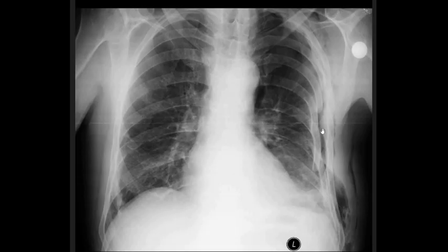And we can see that here is some space, this dark space, where we would expect also to see lung vasculature, but we can see that there is no lung vasculature. So actually here is also a small partial pneumothorax. One interesting thing on this X-ray also to identify: we see how here this is the subcutaneous tissue. So here would be somewhere the skin, and this is the subcutaneous tissue.